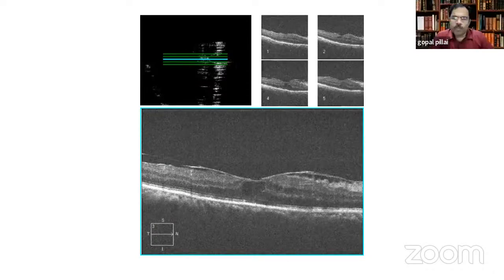Okay, here the epiretinal membrane has not significantly changed the macular morphology. The contour of the macula is almost preserved. But the only thing is, there is a cyst which has developed there, which signifies that this may have been a long-standing epiretinal membrane. Whenever there is a long-standing epiretinal membrane, there will be more damage. Even the outer retina may show damage, and that is why the ISOS junction may show abnormality.